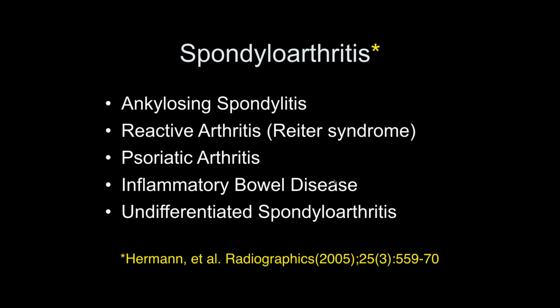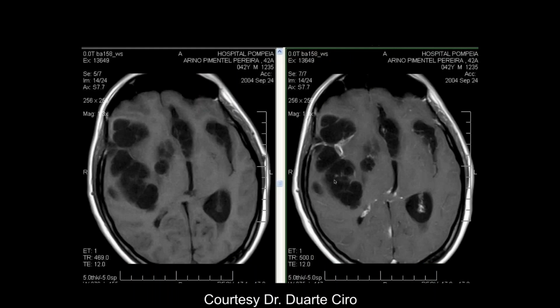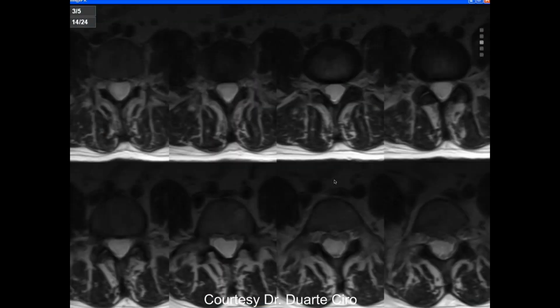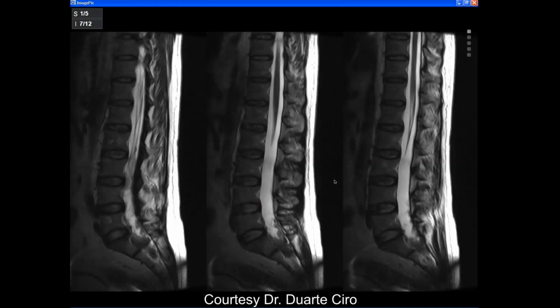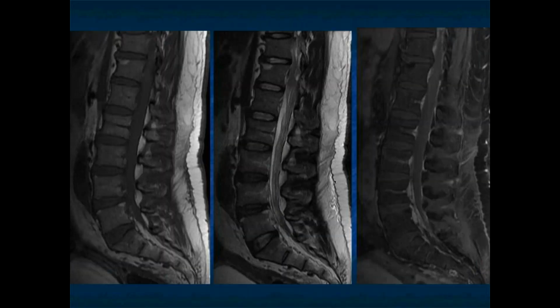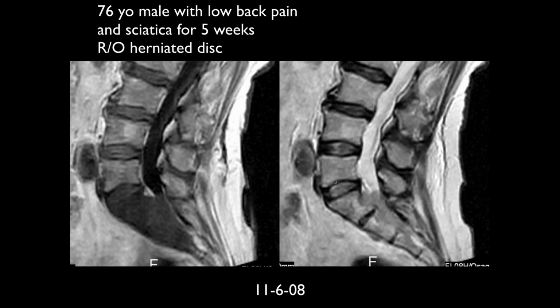Okay. So why don't we move now outside of infectious diseases and go into spondyloarthritis. Sorry, I'm just trying to see. There's a lot of stuff that we saw that looks like could have been metastases in the bone, in the spine. Where? Well, some of the stuff we saw, there was some imaging overlap, I would think. For instance, the one with the sternum, a lot of soft tissue, a lot of bone marrow replacement. I have a specific question about that. If we see the loss of, like this one?